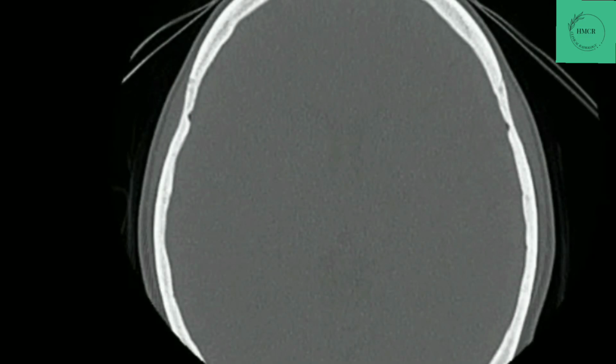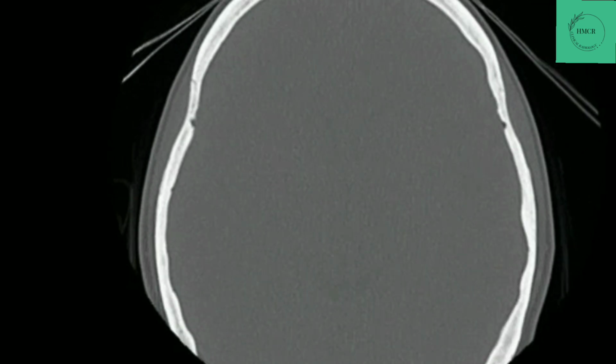Today we will go through another interesting case. This is the CT scan paranasal sinuses of a young patient who presented with complaint of headache and right frontal swelling.